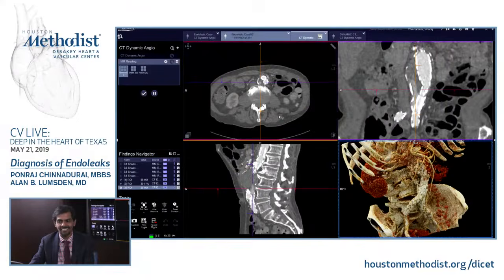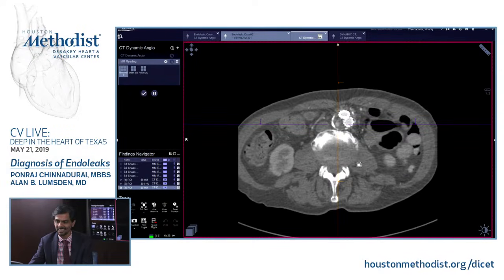And the whole idea is to make it look like anatomy, not black and white fuzzy images that you need magicians to interpret. Although this is a great picture, it is generated from the source data. When we are making a diagnosis, this is a good picture to get a rough overview before you walk into the procedure. But the real data still lies on these cross-sectional images.